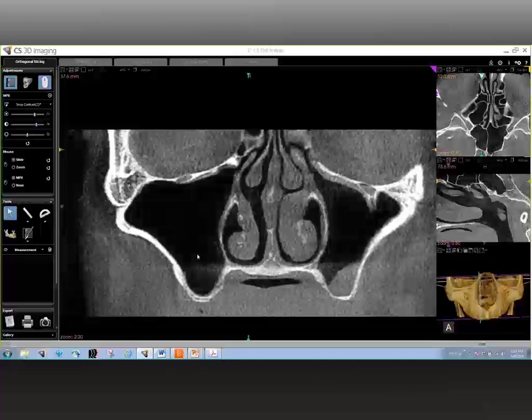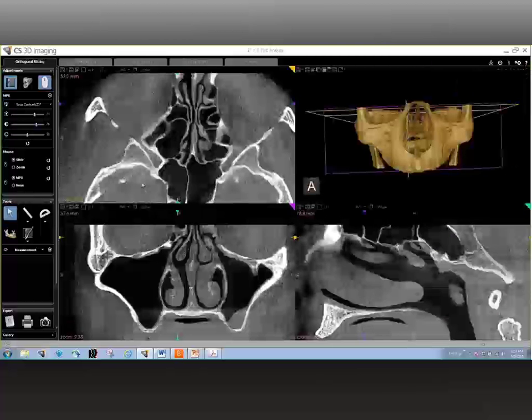Okay, so what does one do if occult pathology is noted within the sinuses? Well, I think, Jordan, you're referring to what you're seeing in the sinus right now, the little bit gray area that you see within the sinus. Yeah. That is a good question. Now, if you notice, it's actually bilateral. When we move the scan, you can see that it's not just on the left side. You can also see it on the right side.